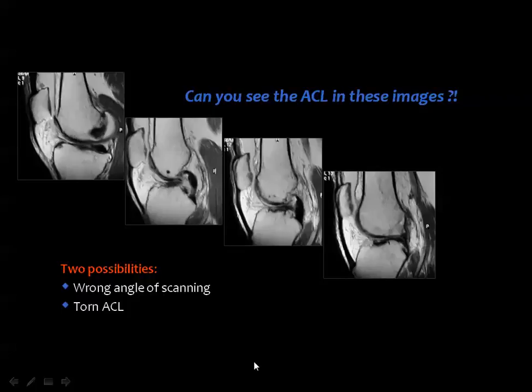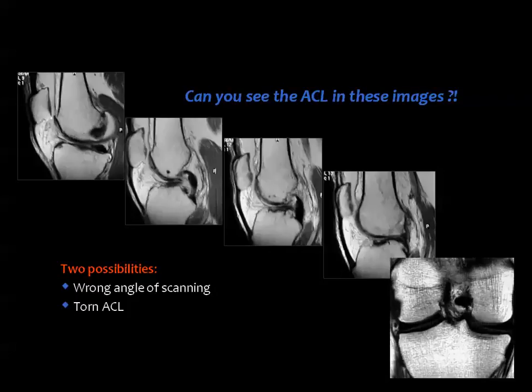In the beginning era of MRI, we used to bring the patient back and sit beside the technician to set the right angle for ACL identification. But now you can easily look in the coronal image in the intercondylar notch.